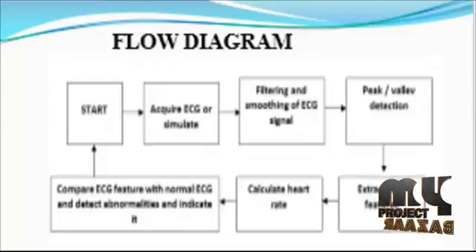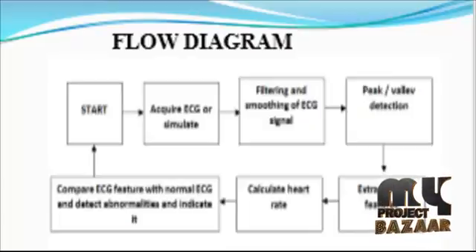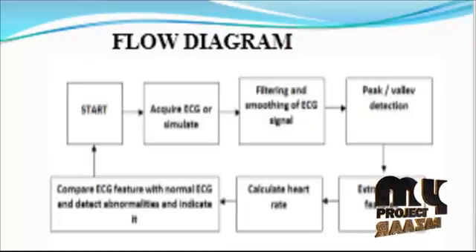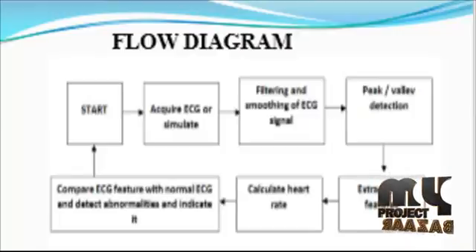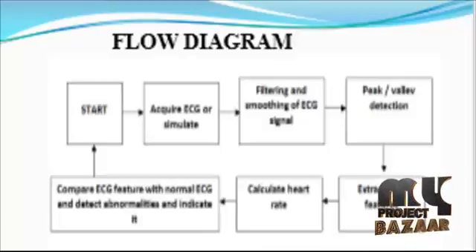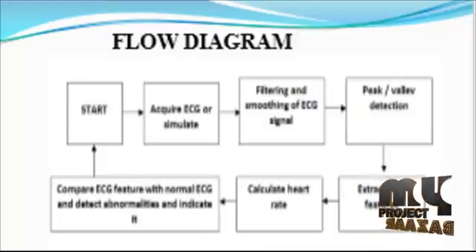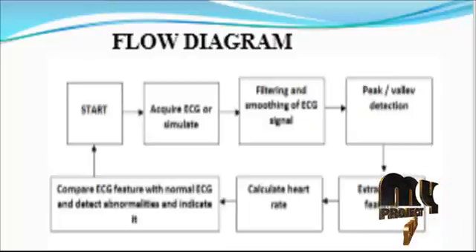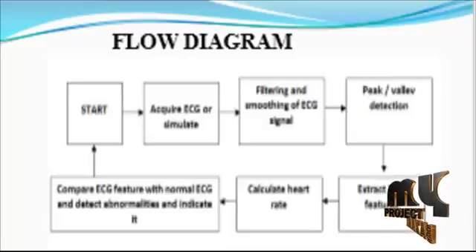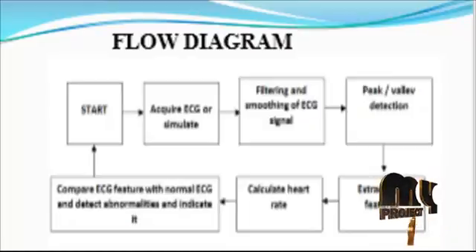The signal is passed to the ECG feature extractor, which gives parameters of the ECG waveform to calculate the heart rate, along with the first, maximum and minimum values from the program. The processed signals are used to decide the threshold needed for peak and valley detection. The virtual instrument here provides the periods from peak and valley. Thus, the heart rate based on the peak and valley is obtained.